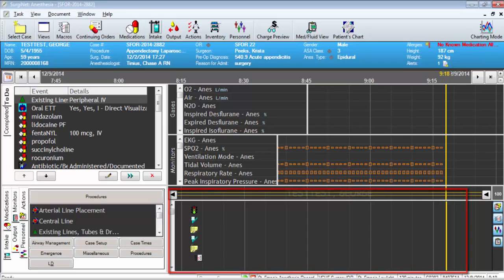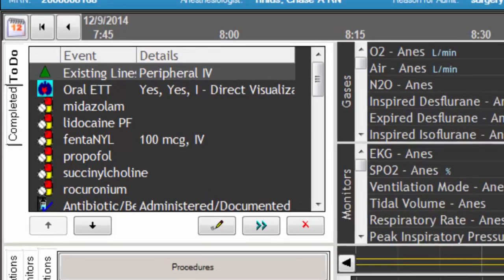It should be noted that this one action of launching a macro has performed many different setup tasks needed for your case. We will review each of these in detail, as well as the various areas within the application screen you now see. Let's start with the to-do list.